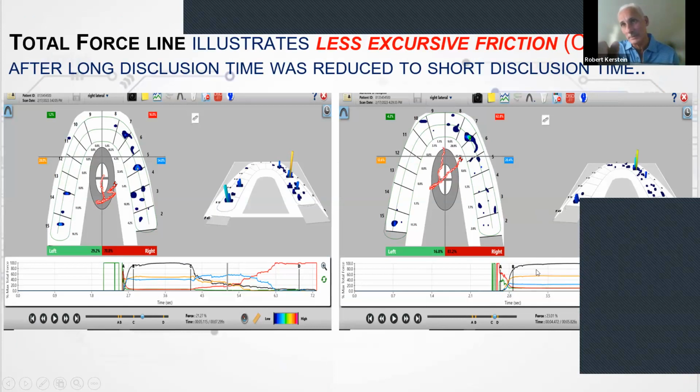You want to see the patient be able to hold their teeth together well. What's interesting about this patient is, even though she has a couple of hitches, she actually has less of a decline postoperatively than preoperatively. She has more of an arc and a waver than she does when her bite is improved. Here she has a little bit of wavering, which is no question similar to this, but then she really holds her bite together really well. This is after treating her. That's what I mean about how you use the data to show that you made a difference.